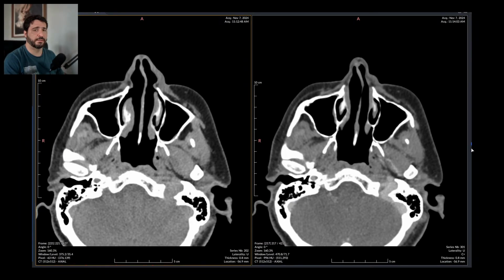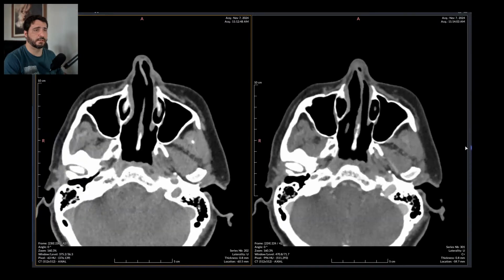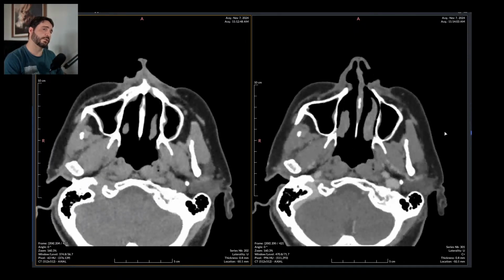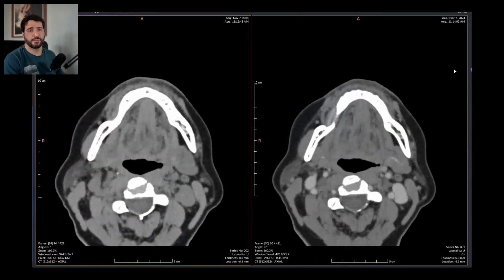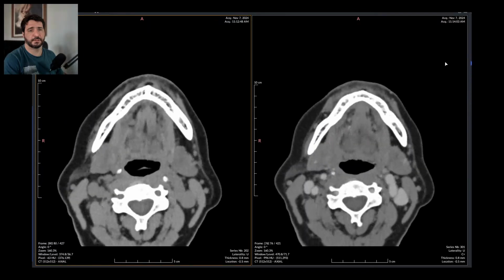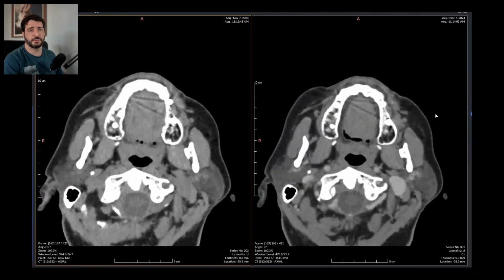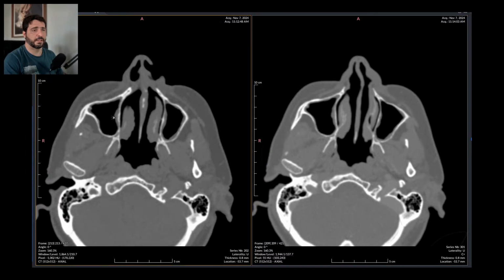It's asymmetrical, but remember this skin is crooked. It's to a side, and it could be just a malposition, a bad positioning artifact, an artifact of a malpositioned patient. We can't really be sure. That is, let's just make it bony.